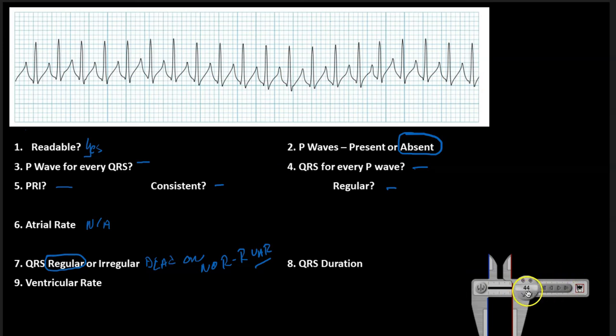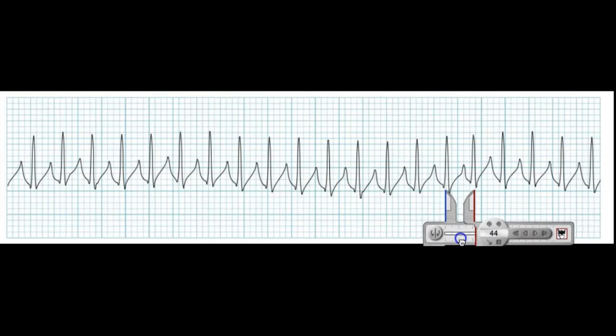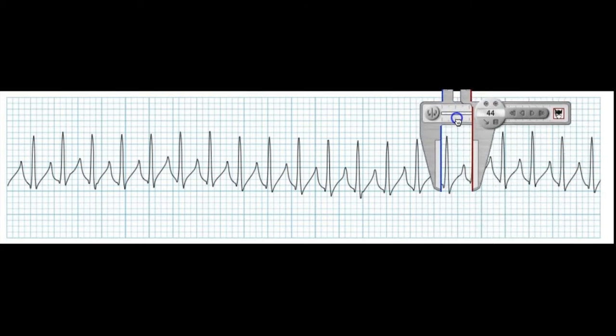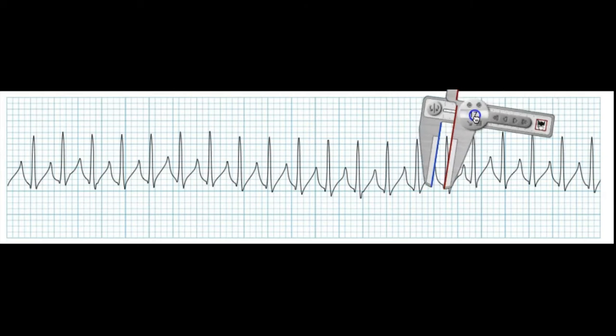Now let's look at our QRS duration. So we'll bring our calipers back up here. And now we're going to, again, and I think just for this one, we're going to use this side of the calipers. And we're going to just line things up.